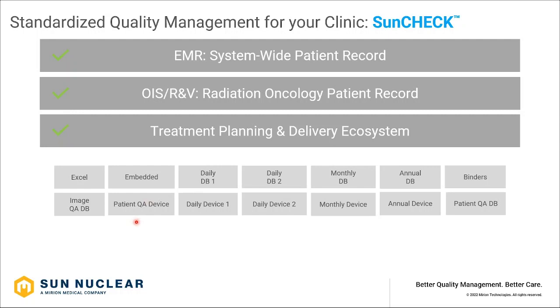Within SunCheck Machine, we also integrate with several of our QA devices, and this would include primarily our Daily QA3 device, as well as the IC Profiler.